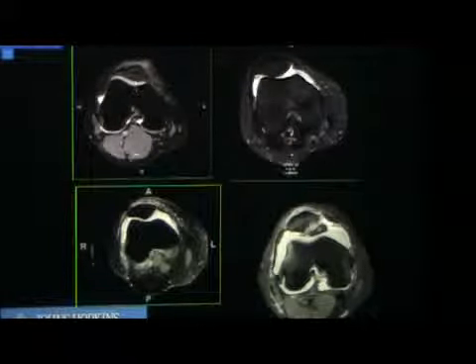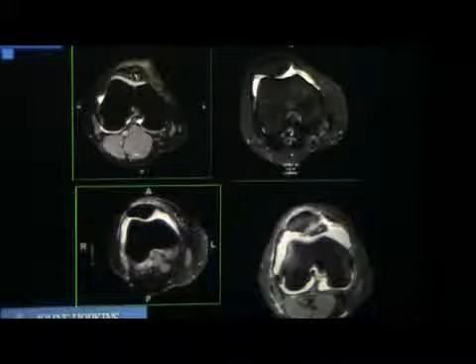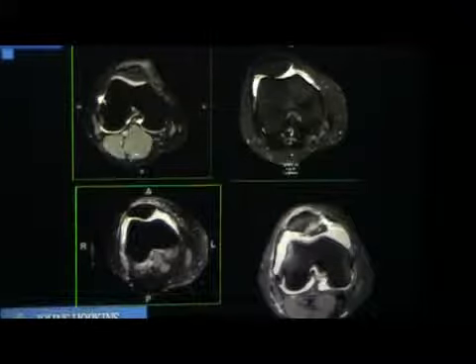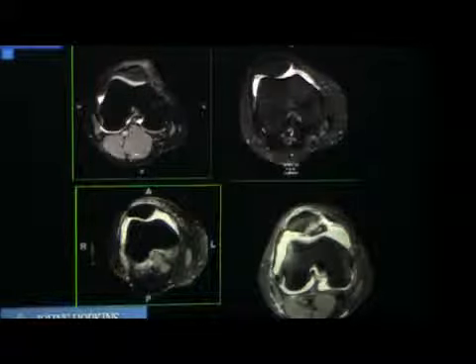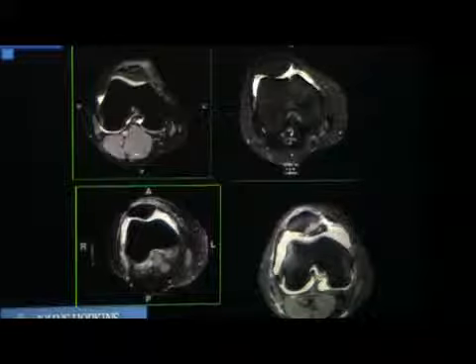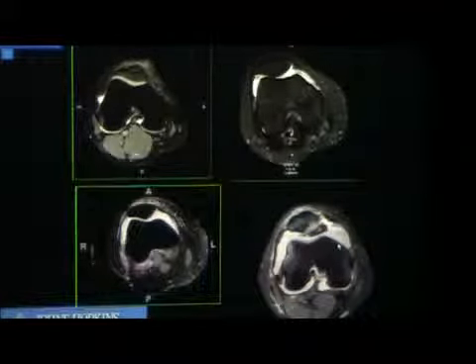So in the middle section, if the fluid in the suprapatellar pouch is more than 5 millimeters in thickness, the AP dimension, or laterally if it's more than 10 millimeters, transverse dimension, then you call effusion. Okay, so there is no effusion here. This small effusion here, more than 5 millimeters. Okay, this is moderate and this is large.